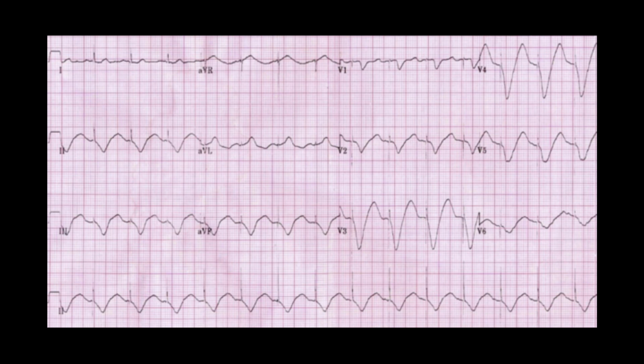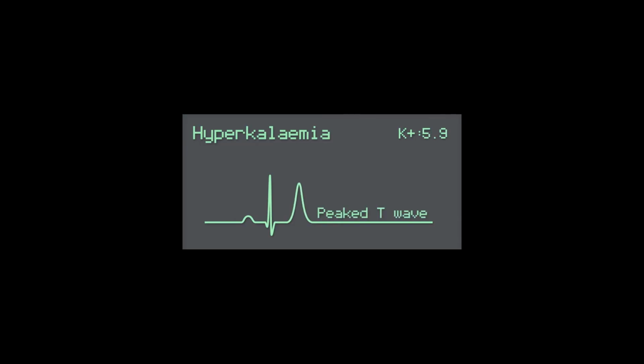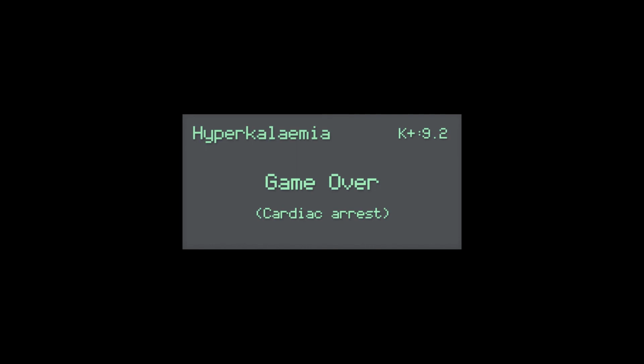So it's really important, again, to be able to quickly pick up and identify what hyperkalemia looks like on an ECG. I think that's a very important one as an emergency medicine provider to know.